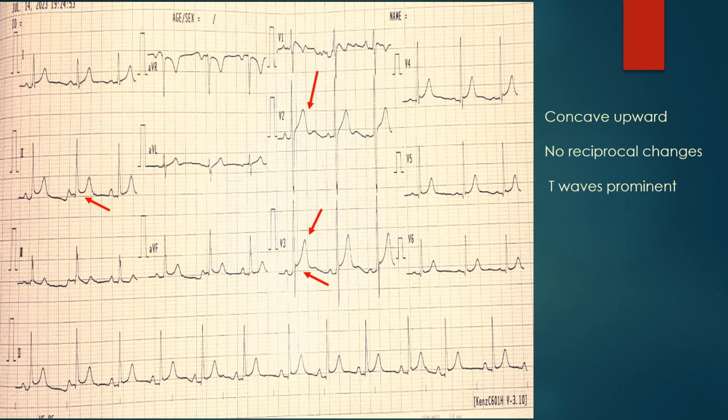The T waves look a bit prominent. Now obviously, in the early stage of MI, the T waves usually are hyperacute or prominent. Now, is it the early phase of the MI or is this something else? Let's move ahead.